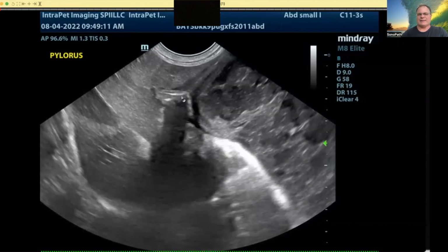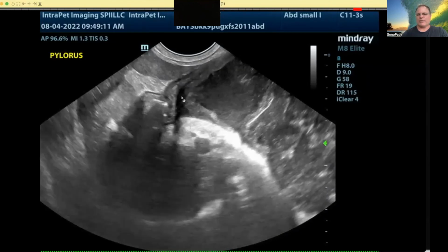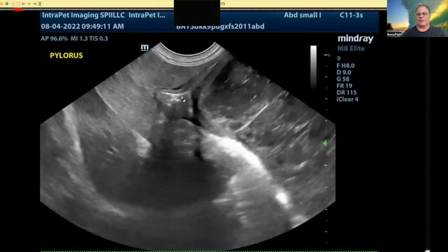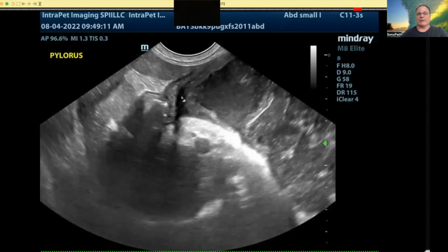Follow the lines. And next month, or next installment of the lineage series, we're going to look at another case of intestinal patterns that are getting disrupted. And then we'll move on and on and on. So we should be putting these out there every month. I hope you like what you see.